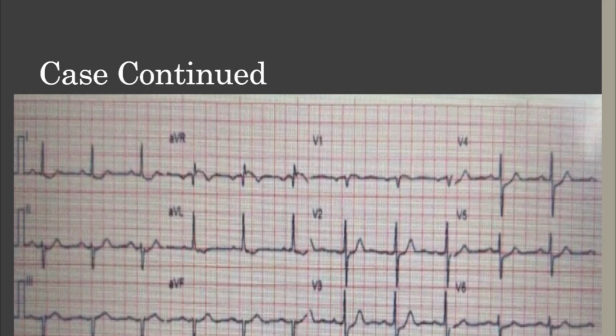Now back to the case. The AIVR spontaneously resolved after a very short duration, and this is the next 12 lead. As we can see, the previously noted depression in V2 to V6 has improved significantly. At this point, the previously shown posterior was obtained. After a few minutes, depression worsened, with depression in V1 through V6, and the patient's level of pain increased.